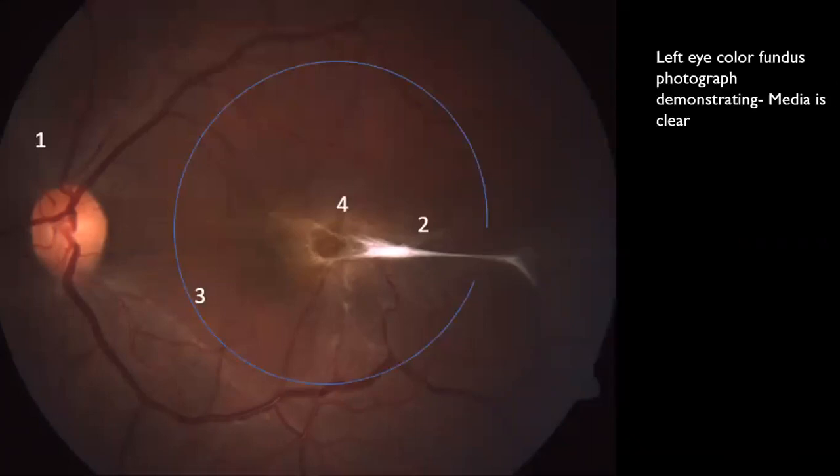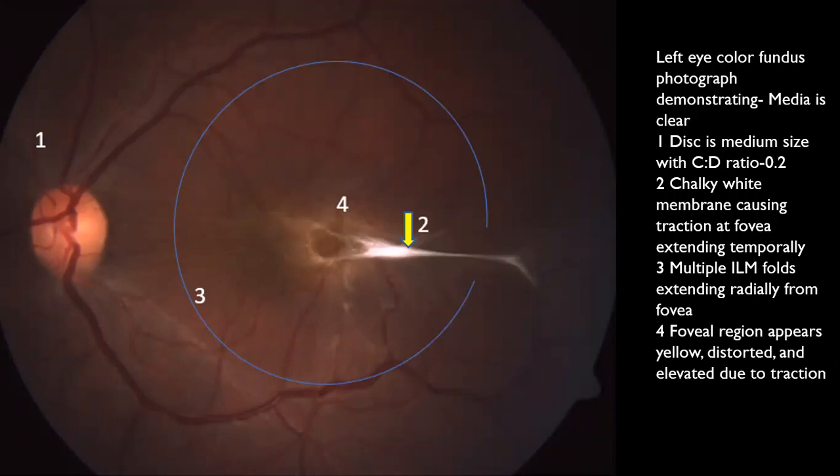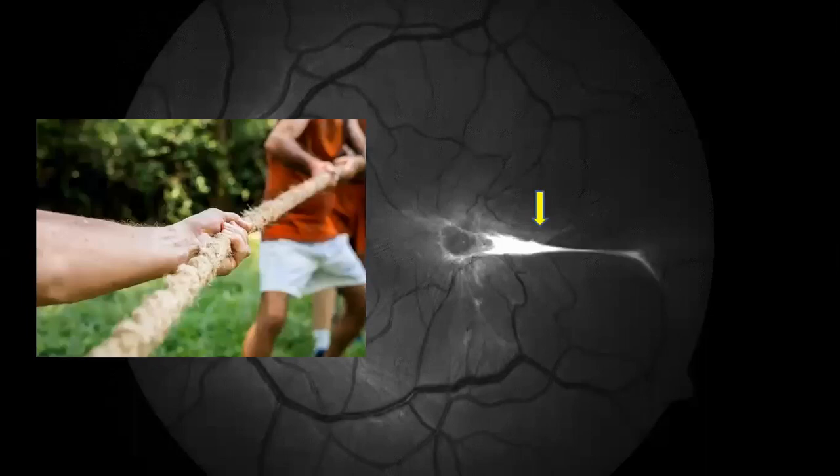So this is the fundus photograph of the left eye demonstrating a clear media, normal disc, a chalky white membrane causing traction in the fovea extending temporally and anteriorly into the vitreous. Multiple ILM folds extending radially from the fovea. Foveal region appears distorted, yellow, and elevated due to traction. Also notice the grayish hue. Red-free fundus photograph clearly outlines the chalky white membrane, giving an appearance of tug of war inside the eye.